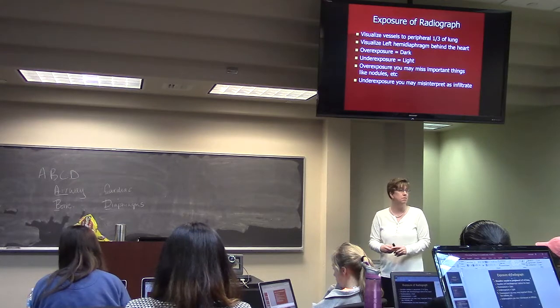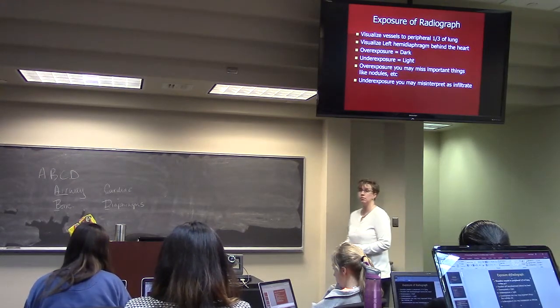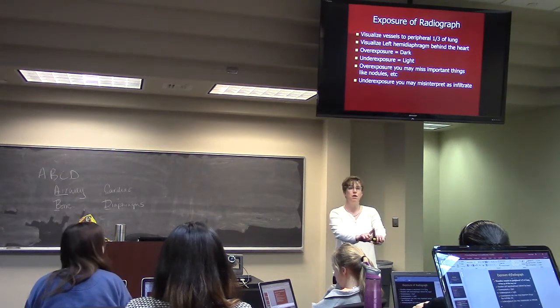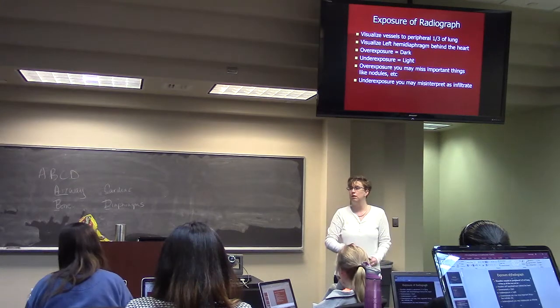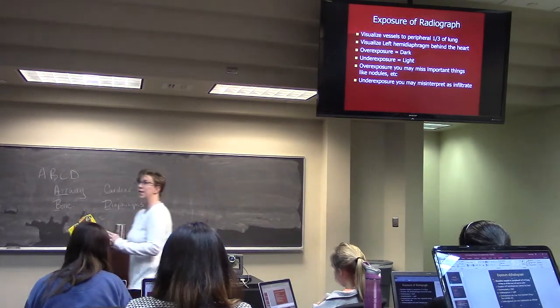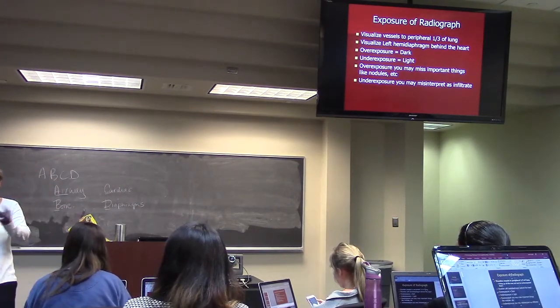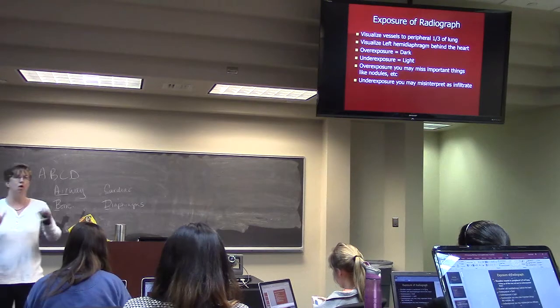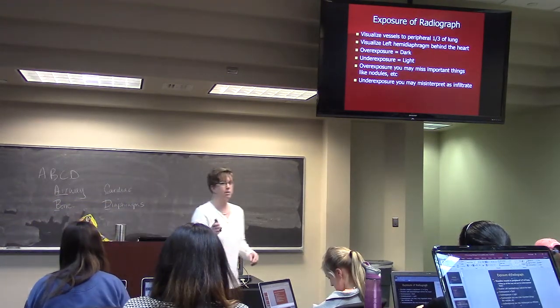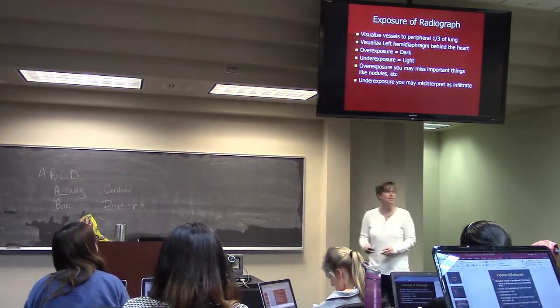I've underexposed them. Okay? But you got to put that together with the spine, because they may have something going on in the lungs that shows that they have white blood vessels. We're going to talk about the different terms, going all the way out. It's going to make more sense in a minute. I know this doesn't make sense yet, but it will.